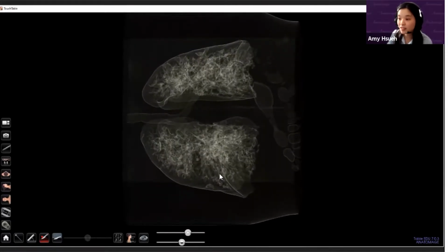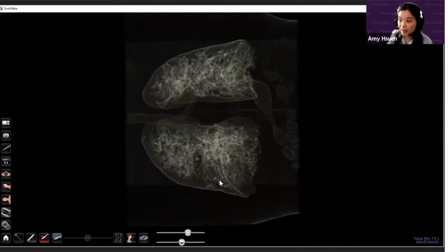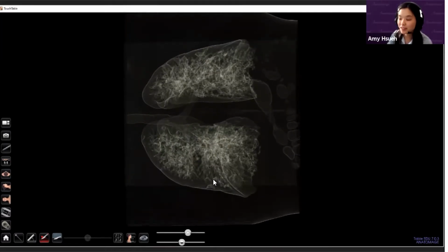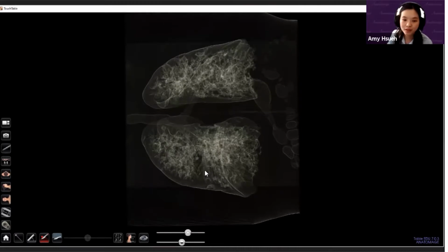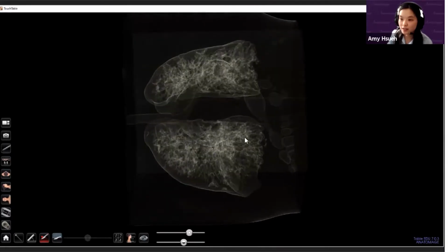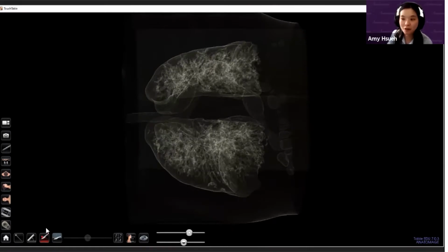The coronavirus scan is actually included in our 703 update already. If you have that update, it's case number 7200. And it will definitely be included in our table 8 update as well. You can definitely see the classic glassy look of the coronavirus here. So you can still clip through them, create your own presets, annotate everything, do measurements, all of that.